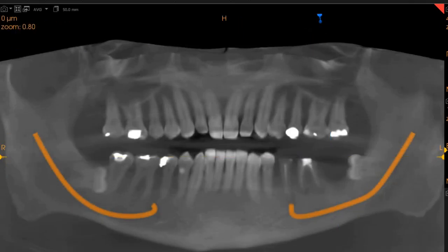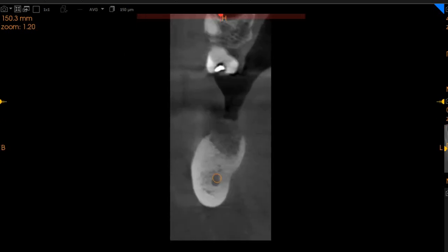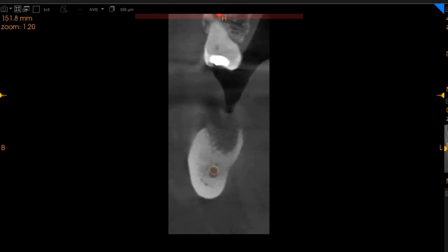On the transaxial view, which is basically the proximal view, we can very clearly show you that the lower right 7 has, this is where the roots have been extracted from, this area right here. So this is the area where we've got a bony defect, but to calculate the measurement of the ridge, we've got approximately 10 millimeters of ridge width with a good 10 millimeters of height. But other than that, we've got very radio opaque solid bones.